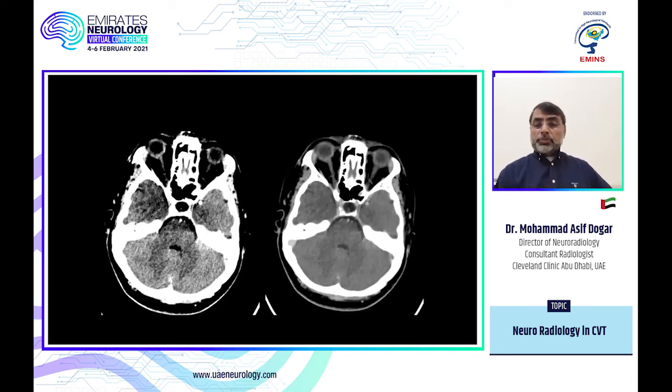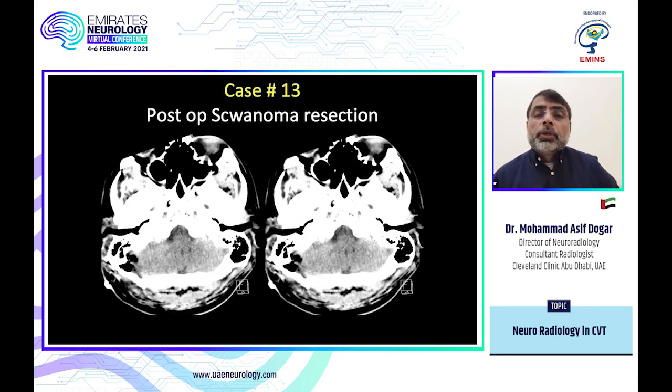And here of the same patient, hard to see anything on this image. We change the window and you can see the filling defect in the sigmoid sulcus or the sigmoid sinus. This patient has had surgery. So whenever there's a posterior fossa surgery, I look very hard at the transverse and the sigmoid sinus.